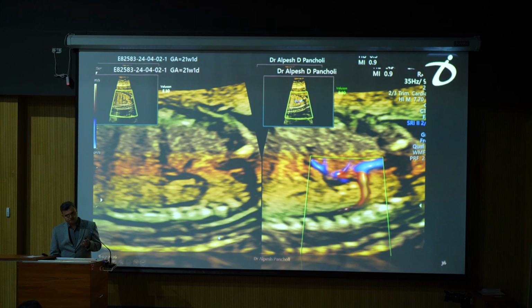Coming to type 2, that is DVSS, here the umbilical vein goes directly into the IVC but with a narrow junction and aliasing. Here the junction is narrow. Coming to type 3A, that is intrahepatic portosystemic shunt. Here there is a connection between the umbilical vein or the portal vein and one of the hepatic veins. Type 3B, that is the extrahepatic systemic shunt. Here there will be no portal system and the splenic vein or the main portal vein going directly into the IVC.